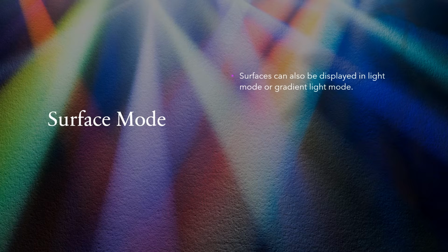As we discussed earlier, the threshold parameter determines which structures are visualized in the surface rendering. By excluding voxels with grayscale values below the set threshold, the clinician can highlight the most relevant anatomical features and improve the overall clarity of the image. The ability to apply colors or tints to the surface rendering allows for enhanced contrast and better differentiation between tissues or structures, helping to improve diagnostic accuracy.